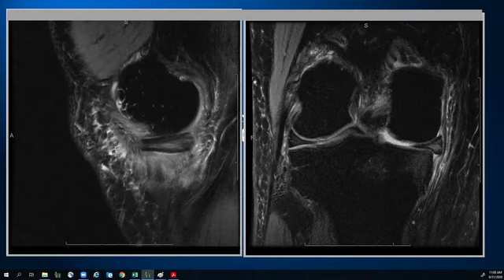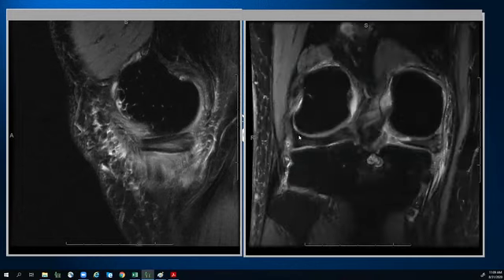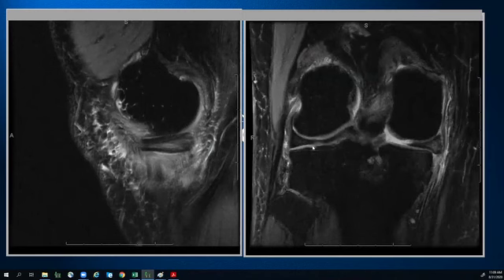And then there was an earlier question, which I believe we touched on, about differentiating these far peripheral vertical tears from meniscal capsular separation. I appreciate the dilemma. I wasn't able to touch on all the dilemmas with menisci. It's impossible to cover so much material in a 1-hour slot. There are a lot of dilemmas, and it would probably take another lecture to discuss all the pitfalls of interpreting these images.